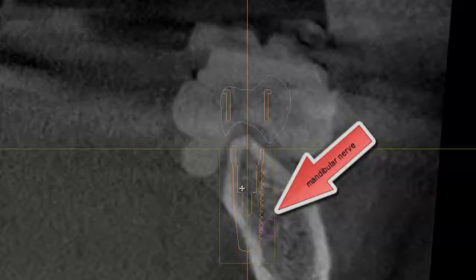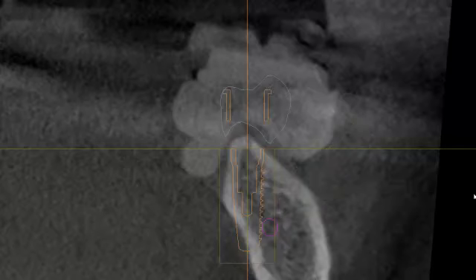So the idea is to keep the implant centered underneath our final restoration, which is the blue outline here, and to keep it contained inside the natural anatomy of the bone and the proper height and width here. You can also appreciate this patient has lost a lot of bone on this angle. The bone used to be about here to here. So we've got the implant placed appropriately.